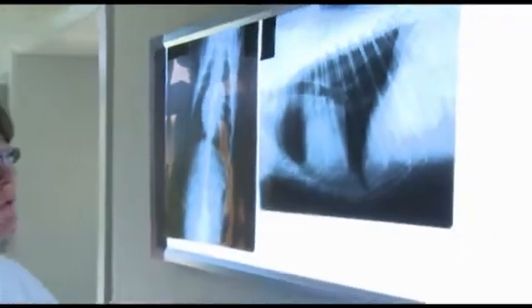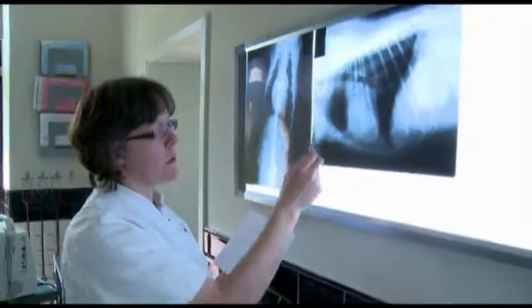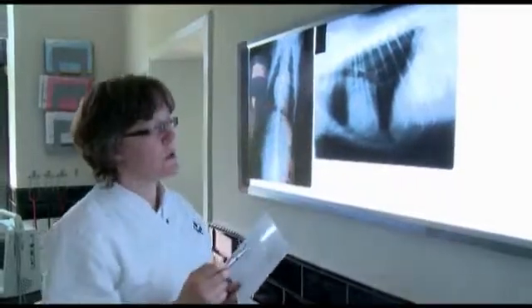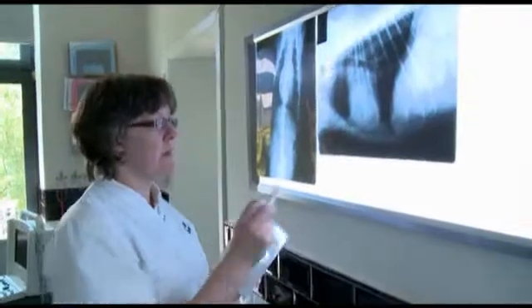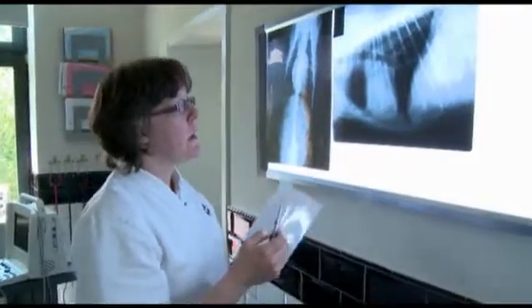Like for the dorsal-ventral radiograph, on the lateral radiograph, we will also first of all examine the extrathoracic structures. Look at the sternum, the vertebrae, the ribs, before concentrating on the area we are really interested in. It can be the pulmonary parenchyma or it can be the cardiac shadow, and very often it is both.